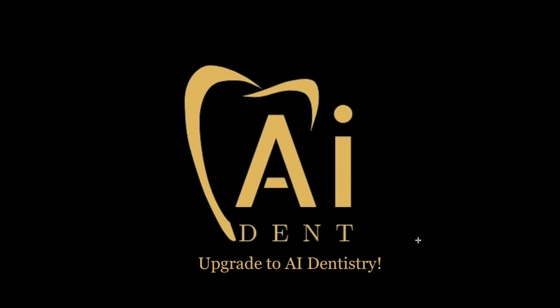Welcome to AI DENT. We are an AI-powered software as a service platform that provides automated dental X-ray analysis by combining AI and cloud technology with years of dental experience and specialized expertise. Let's see AI DENT in action.